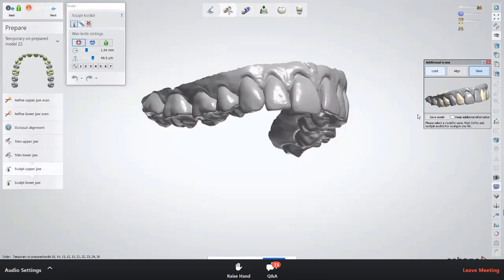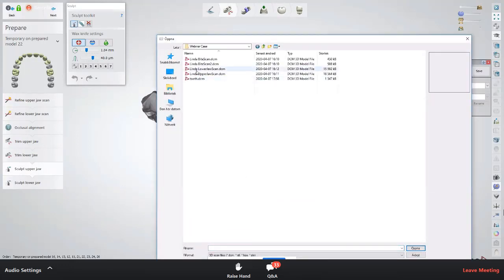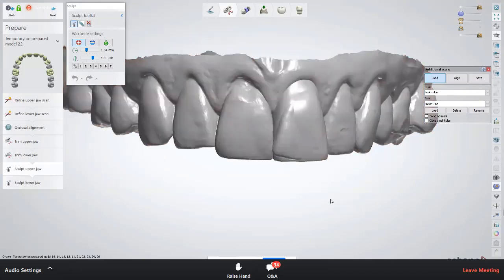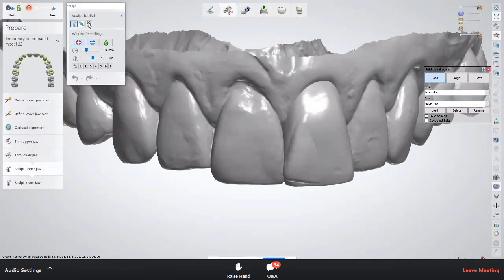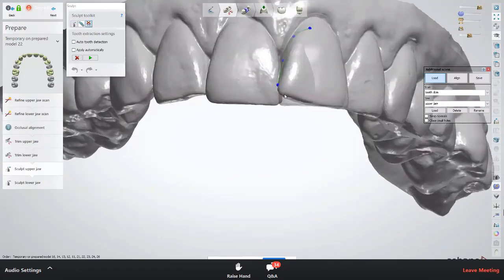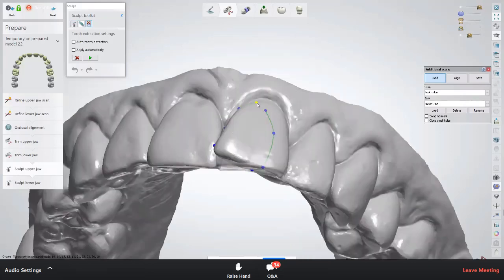And now I load the tooth I've just exported. And we have it here, tooth, perfect. And now basically what I'm seeing is my tooth on top of the other. Let's turn off the, oh, that didn't work. So now I have my design on top of my model. And now what I can do is make this semi-translucent. Normally I don't like extracting the full tooth because we'll try to make a nice model on top of this as well later.